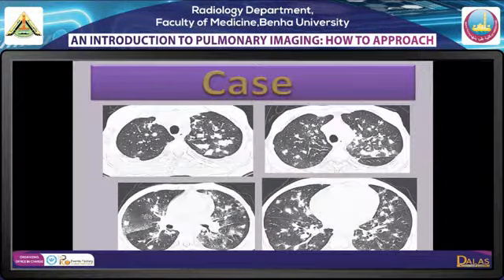الفايندنجز اللي described في الحالة دي are typical of Kaposi. نمبر واحد: الirregular large nodules دول بيتسموا flame shaped nodules. Number two, some of the lesions will have ground glass opacification surrounding them. Number three, some nodules are lying on the fissure.